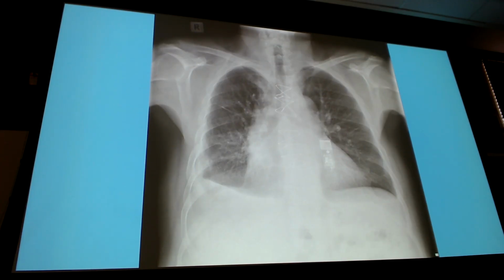Is the trachea being pulled or pushed over? So it does look like the trachea might be getting pulled over a little bit onto the right side. Okay, so that's clue number 1. So clue number 1 says, okay, maybe I have the trachea pulling a little bit. So now what's another thing that we're looking at? I'm playing guess what I'm thinking, I know.